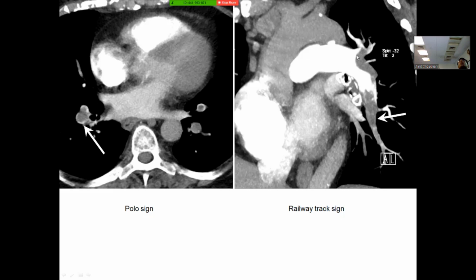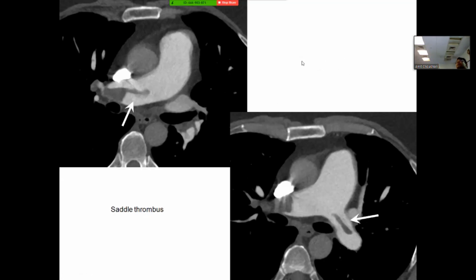Okay, so they are symmetrically parallel. Not necessarily that you will see a parallel line like this. It can be here, it can be here, it can be here. So all these are telltale signs. This is the saddle thrombus. It is in both the arteries, going into the main pulmonary artery. And this can be plaque-like.